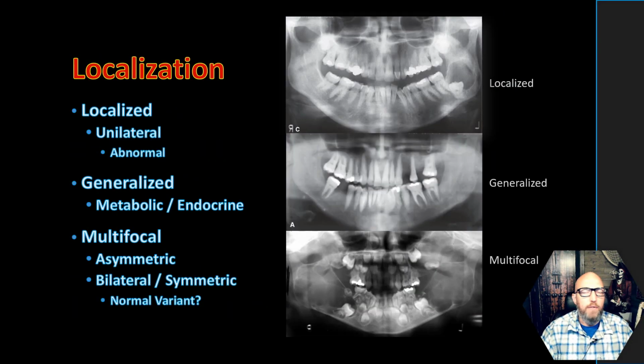And so the first step of that lesion acronym is localization. In the case of a localized lesion like this, like I said, it may be implied that it's a single solitary lesion because you describe a lesion here around the crown of this third molar, which is impacted. But we don't see the same thing on the other side, right? You look all throughout the jaws, mostly looks pretty normal, a couple impacted third molars. But as far as pathology, we're really just focused on that area right there.